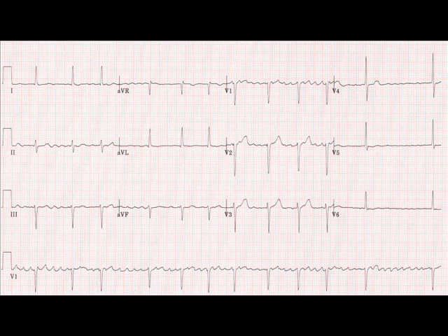It's constant churning electrical activity within the atrial area. Therefore, it's impossible to say what the PR interval is, and as stated, impossible to say there is one P wave per QRS complex. But just hold that information. The patient is not in sinus rhythm, and we'll start pulling the clues together. But let's have a look at the QRS complex.